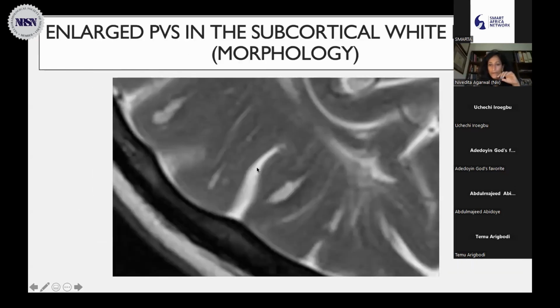They might even have a different shape. Why am I talking about perivascular spaces? Because the ISF, the interstitial fluid, if it's blocked, the space will basically enlarge, and these are considered a marker of blocked drainage. This is not directly related to hypertension. This is related to the movement of neurofluids, which is all part of pressure changes within the brain.